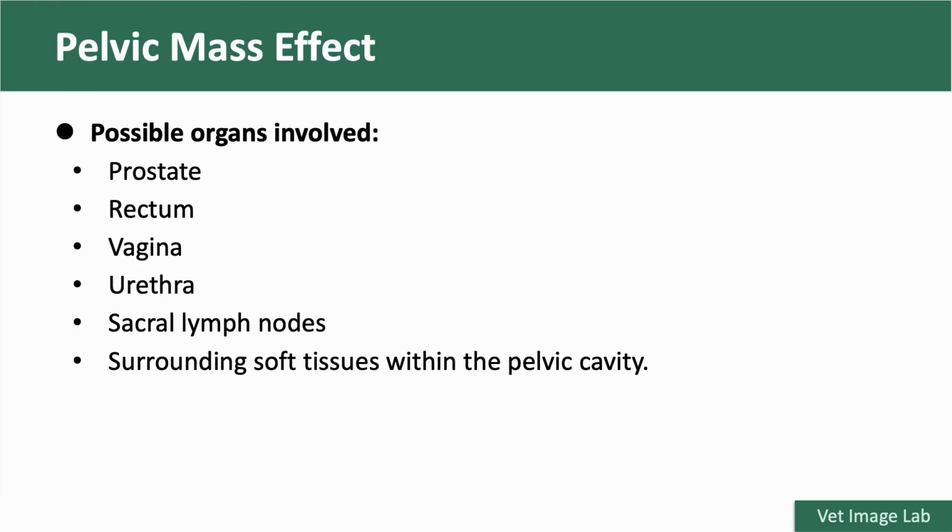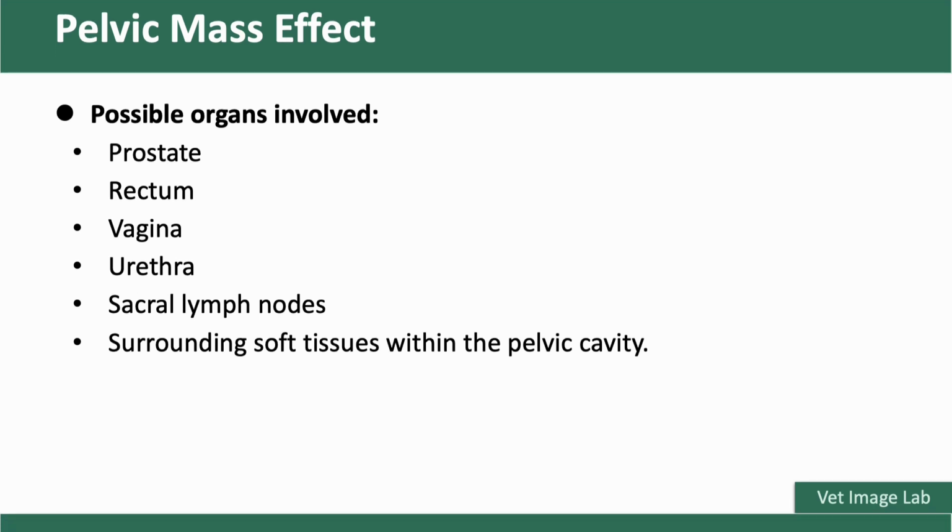When you observe this kind of pelvic mass effect, consider pathologic changes originating from the prostate, rectum, vagina, urethra, sacral lymph nodes, or surrounding soft tissues within the pelvic cavity.